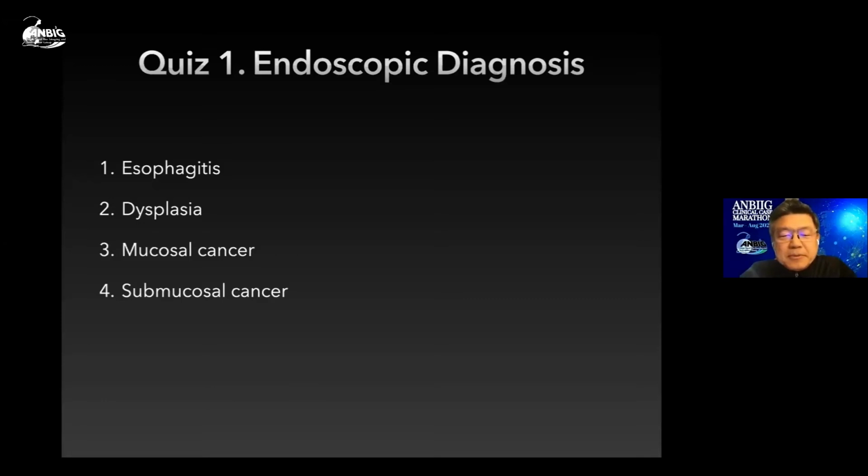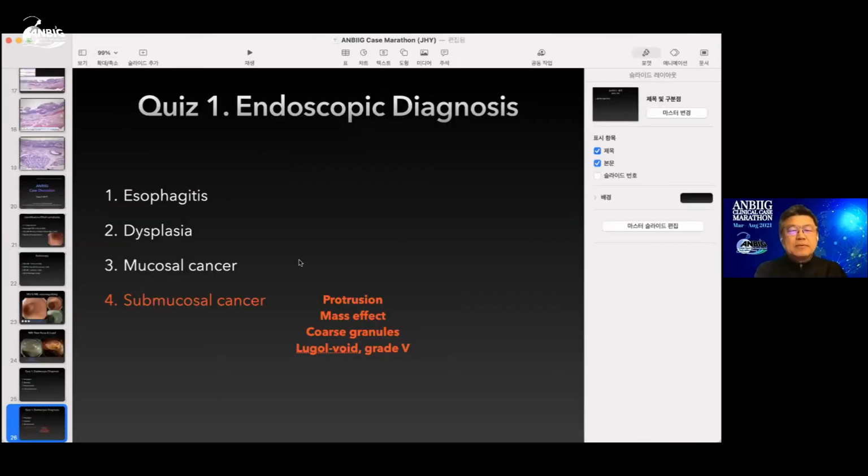Most of the participants hesitated to choose one. So one third said benign, one third mucosal cancer, and the others submucosal cancer. Yeah, I understand. Because of the size issue, maybe dysplastic or mucosal, but the suspicious submucosal vascular structures mean submucosal invasion.